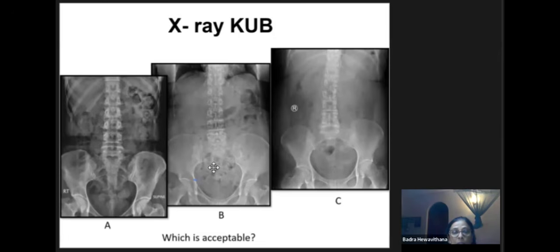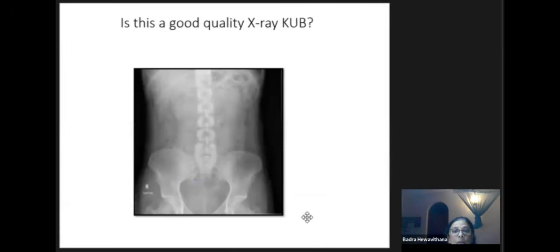Don't repeat the X-ray. I told you it is 35 times more than the chest X-ray. So I think this is also acceptable. But this is the best. But don't repeat this kind of X-ray thinking this bowel preparation is not good. So this is the proper preparation.